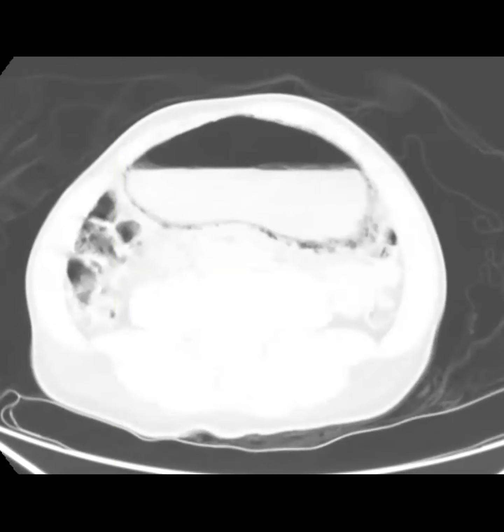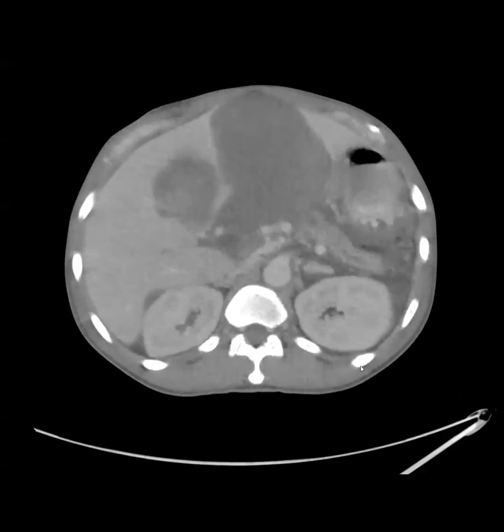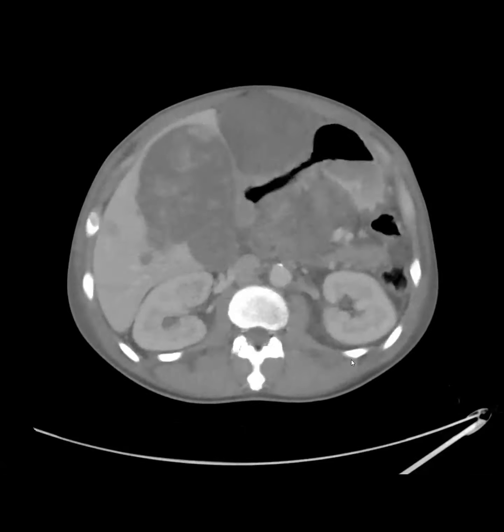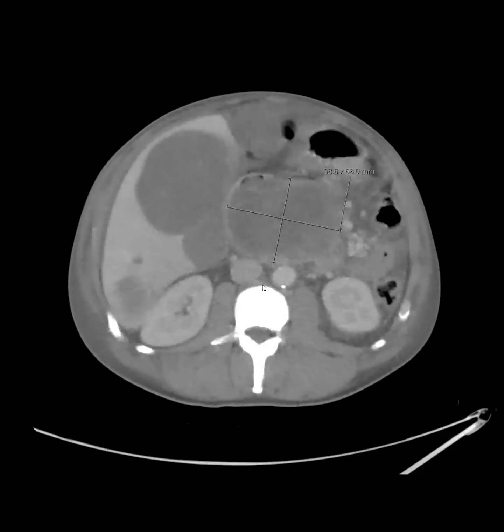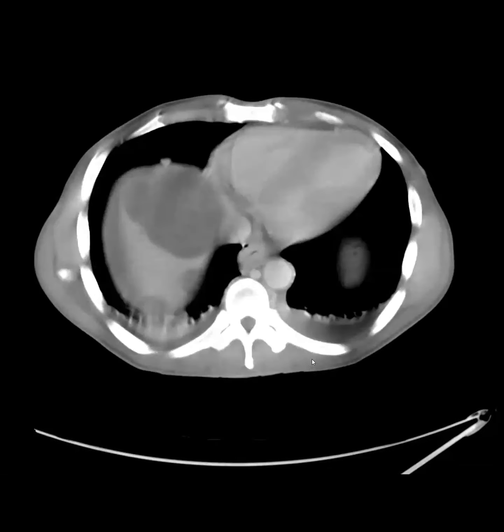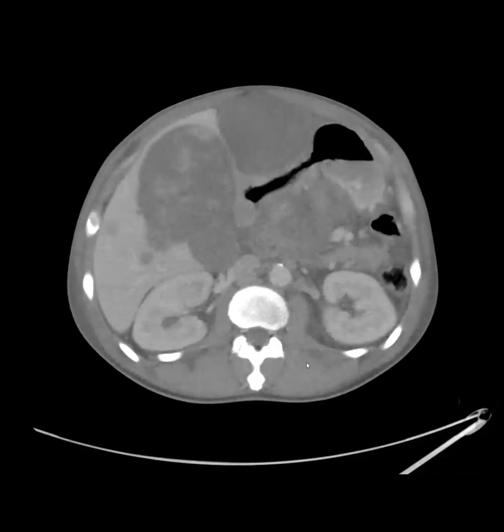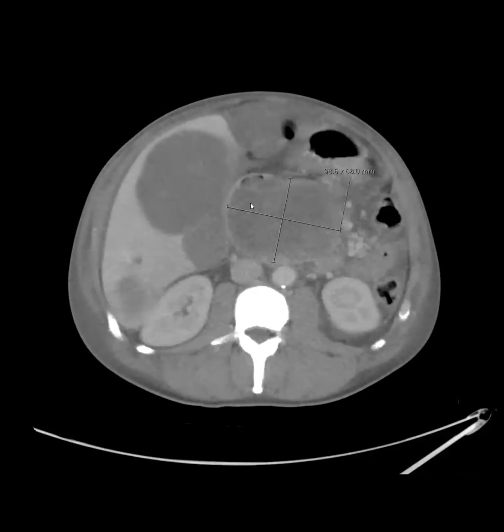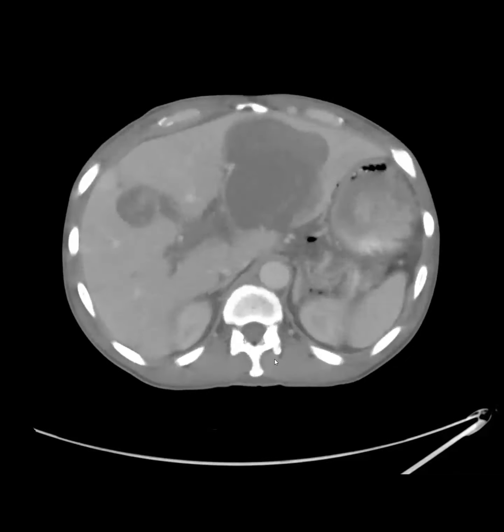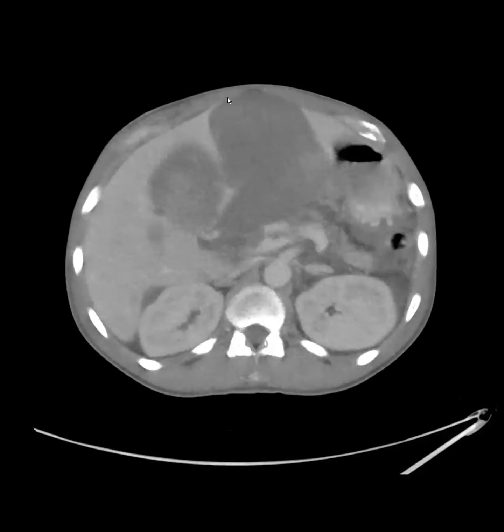And I do have a follow-up CT that basically shows that they're essentially resolving. This is a follow-up CT a week later, and you can see their stomach is basically back to normal. They still have all their big masses and stuff. So that was just a benign gastric emphysema from a mucosal injury. I don't know if it was related to an NG tube or some other kind of injury from maybe the tumor, etc. So even when it's really diffuse, it can be benign.